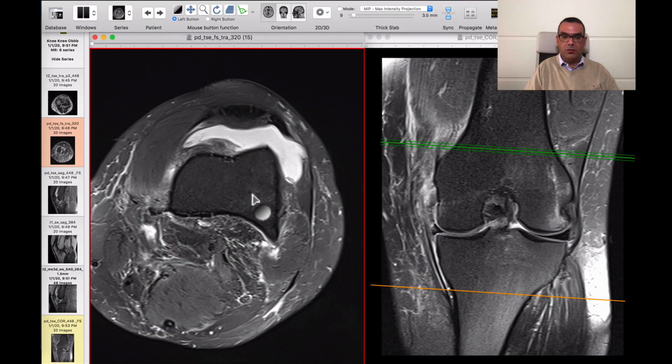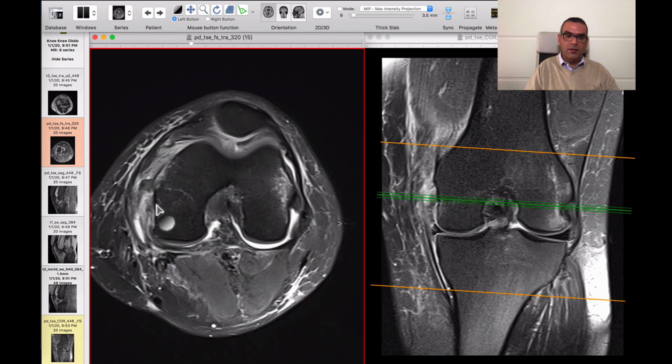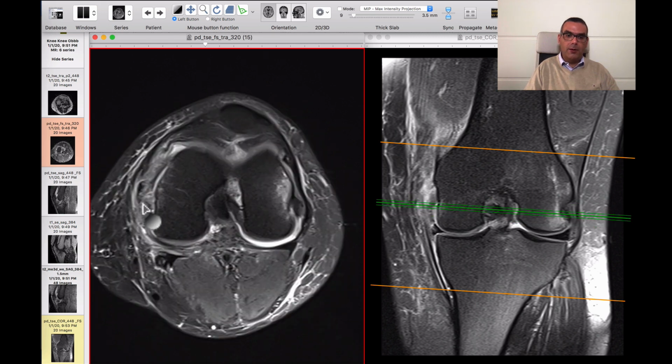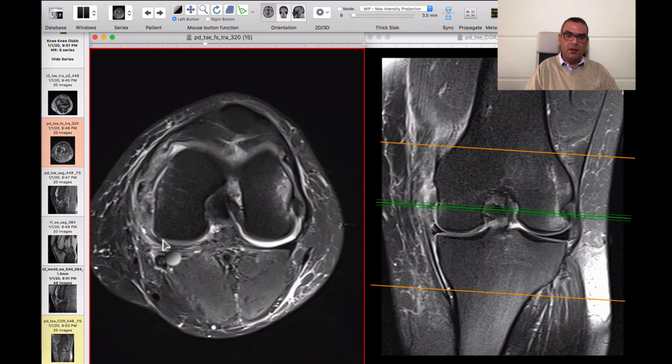As we explained, there is a moderate soft tissue edema and hematoma underlying partial tear of the posterior oblique ligament. Yes, I forgot to elaborate on this. So as we said before, this is the posterior oblique ligament. This is starting just above the level of the MCL attachment, and this is torn as well. So you have also a partial tear of the posterior oblique ligament.